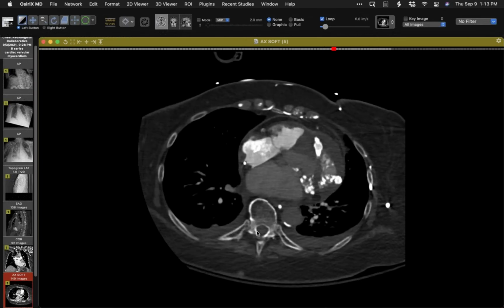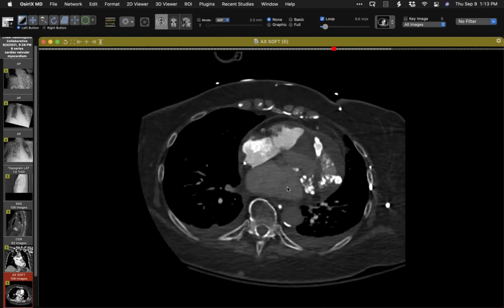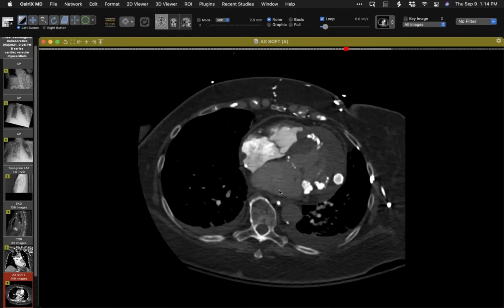So it's a partially calcified item. And typically when we see this, we anticipate that if one were to cut into this and look at it with the naked eye, it would look like caseous material. But it is located in the heart. First time I've seen that.